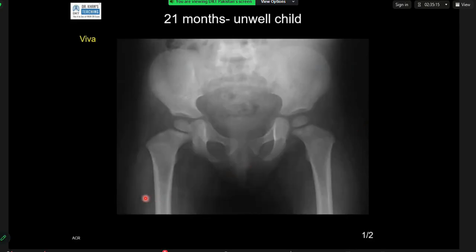Now, reviewing the rest of the skeletal components, the medial aspect of both pubic tubercles, as well as the left inferior pubic ramus, do look more lucent when compared to the remaining bone. The sacroiliac joints appear to be preserved.